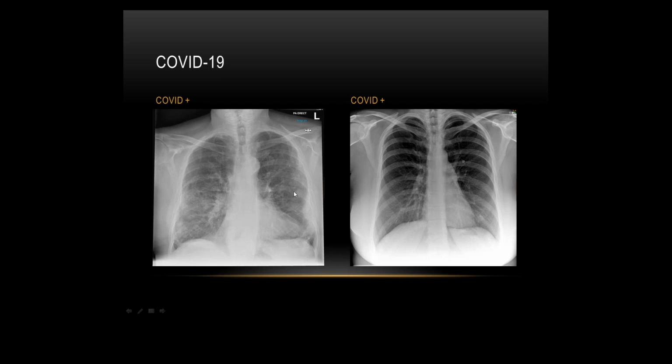So there's just two chest X-rays here. You can see here they've got confluent consolidation, so you've got patchy, ill-defined consolidation here and here, and then some here. We can see the predominant features, it's based in the edges of the lungs. Can you all see that? And then no effusions. These costophrenic angles down here are nice and sharp.